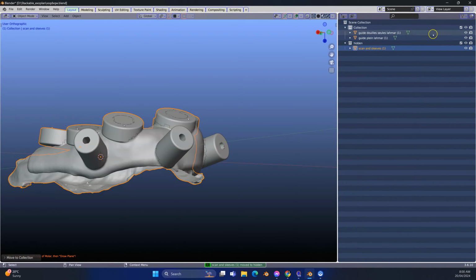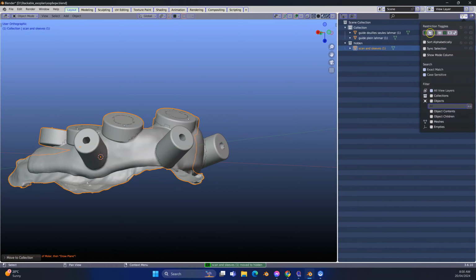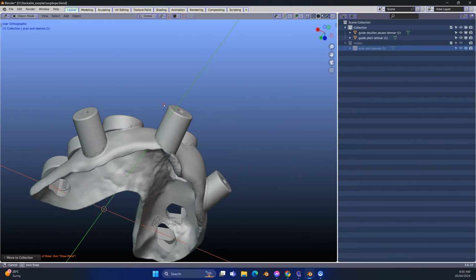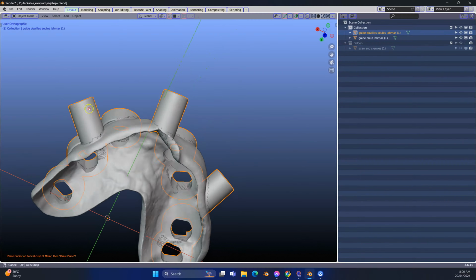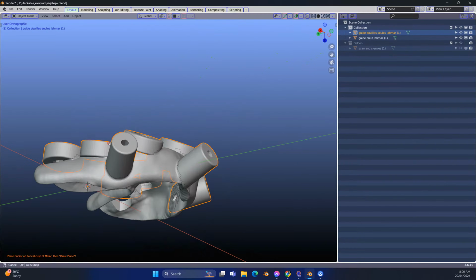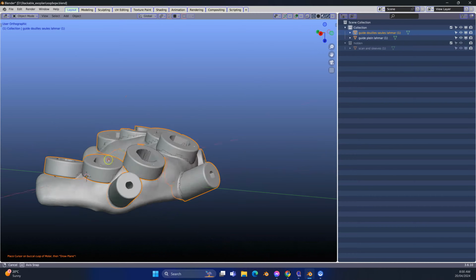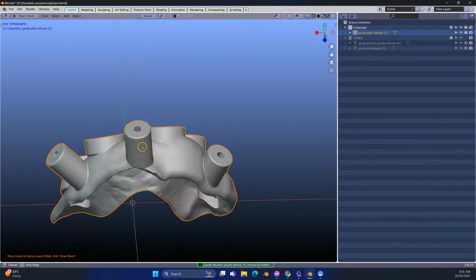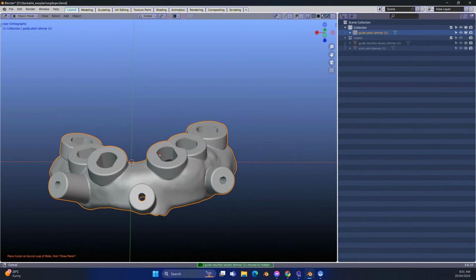OK. Go and open up your model, enabling the arrow and also the screen. It looks like a monitor, and we're going to click on that one to hide it more permanently. Then this one here we don't need either, so M to move into the hidden collection. This is the one that we need at the moment.